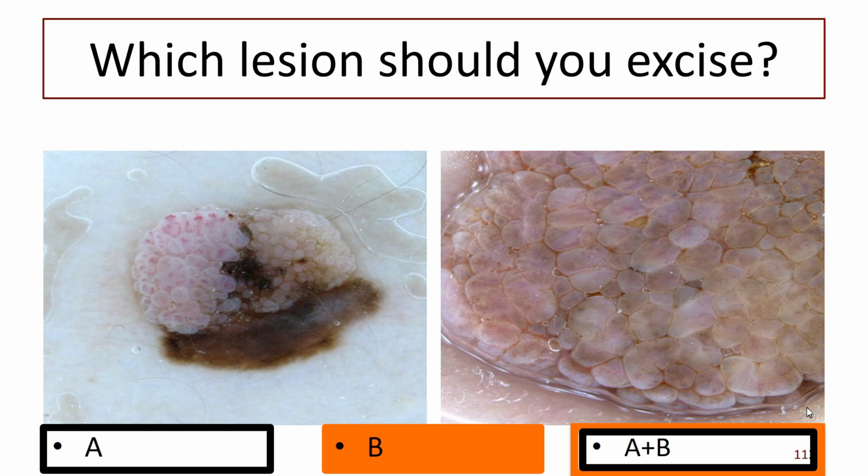What colours can you see? Black and brown. Black, brown, a bit of grey, and in the top part, a bit of purply red. Here, we've got some blood vessels coming in there. They're really weird looking, aren't they? If you look at the blood vessels of this nevus, are you going to hazard a type of nevus for this one?